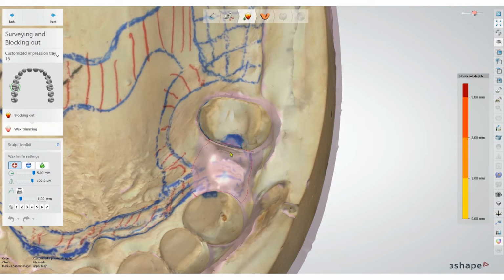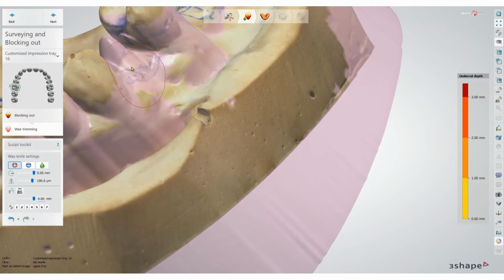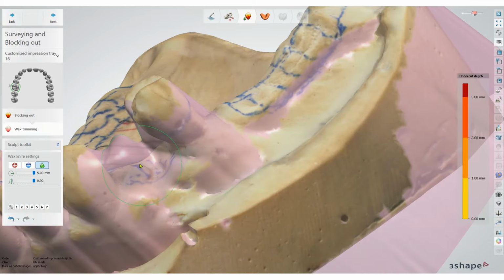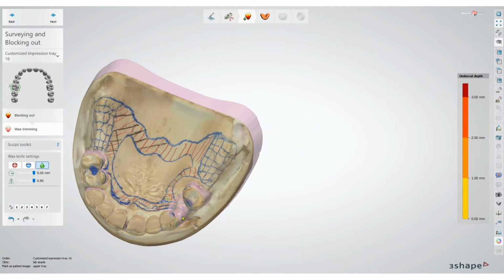Like if you wanted to try and build up in here, you can build up some little bit of a space in there if you really wanted to as well. You know, that's just for you to fit the tray in. If you didn't really care, you don't have to, but obviously that's just going to create a little bit of a spacer more between those 2 points.